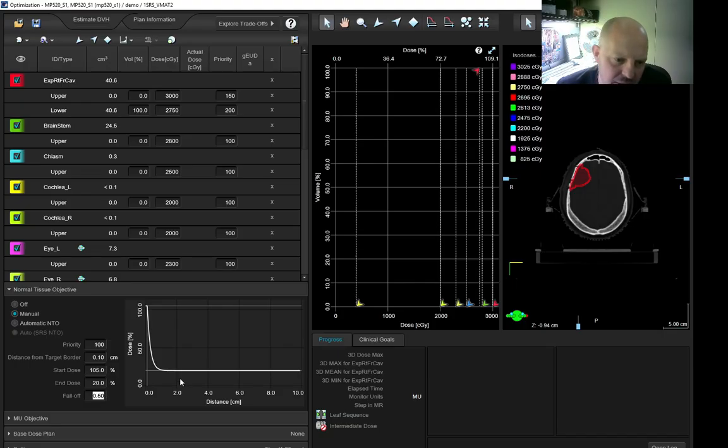So this is basically a measure as to how fast that curve is going to fall off. And you can see here that this will change quite a bit, going from like 0.1 to 0.5, and I think probably that's a decent range to look at. Somewhere in there is going to be the values that you're usually going to use.